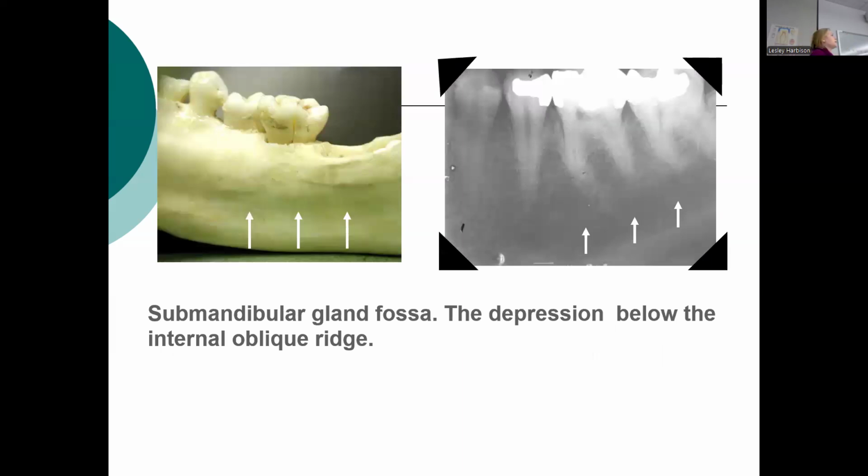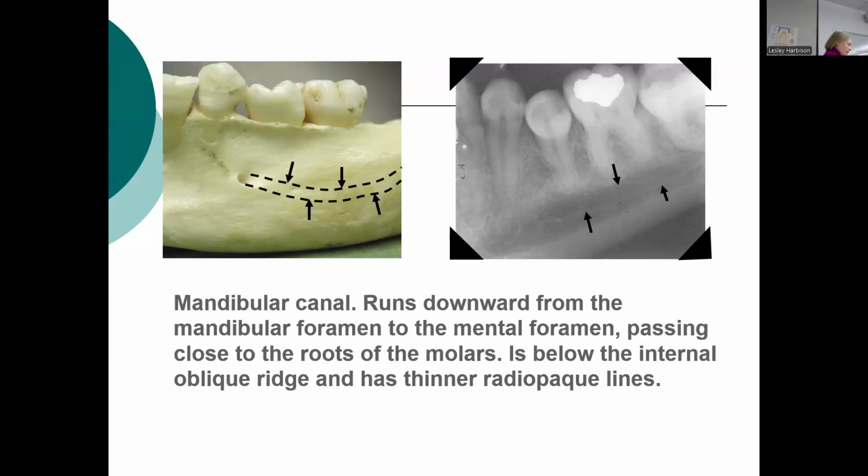So can you go back to the picture that we were looking at? So the arrows on the last picture, the arrow that is pointing down is pointing at the mandibular canal. Yeah, I will admit this is not a great picture of the mandibular canal, but it's trying to give you an example that amongst this big radiolucency, which some of it is the fossa, there is this other part of anatomy that's running through it. So that's what that's trying to highlight.